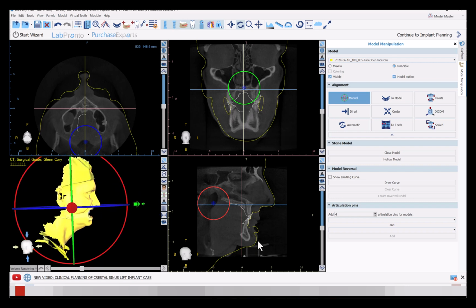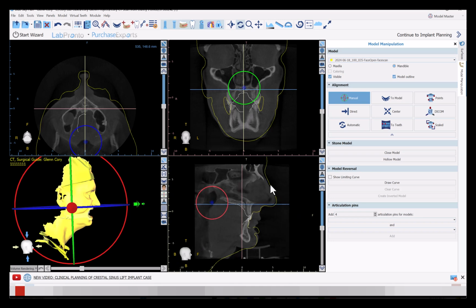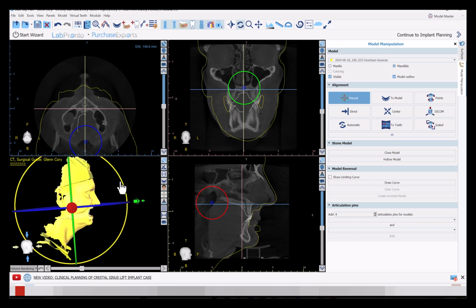So when I'm looking right here, it tracks pretty well along the nose, but as I get up here, you see how it comes off the forehead? So maybe I would have to rotate this back a little bit and then pull it down some and maybe back some. But my point in showing all this, I simply do not do it this way.